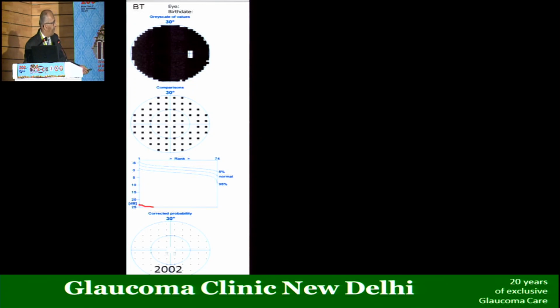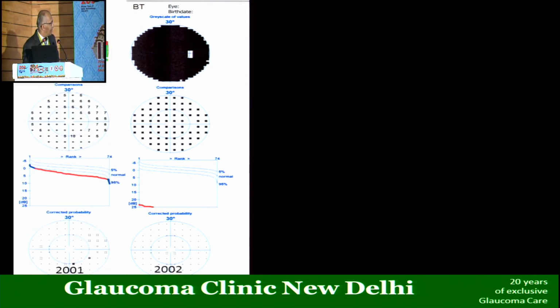Now I've just put this vertically to show you, and this was glaring. I thought I'd made the biggest mistake of my life, calling a person with a normal disc and normal fields, and now this is what I was seeing. While she was waiting, we decided to dilate her eyes. More fields were done. I looked at her previous fields, and this is what it was when she had first come to us. So it was a stare. In the meantime, while she was waiting, 2 or 3 fields were done, and they were all like this, jet black.